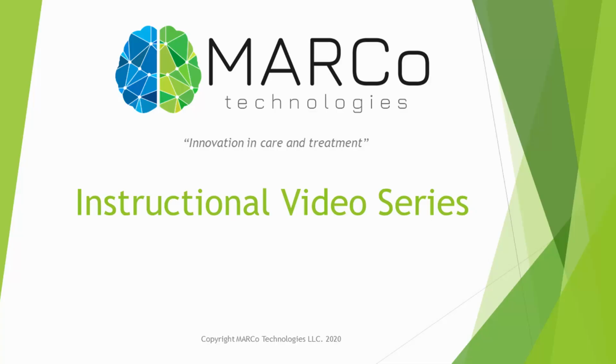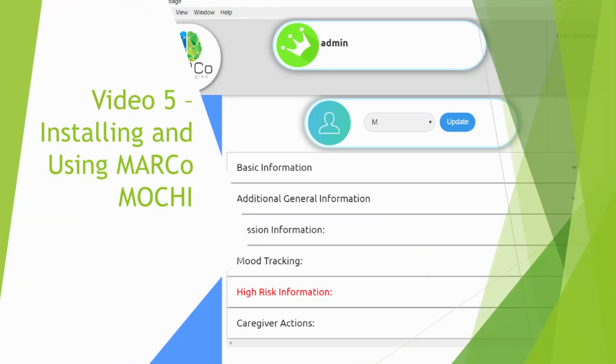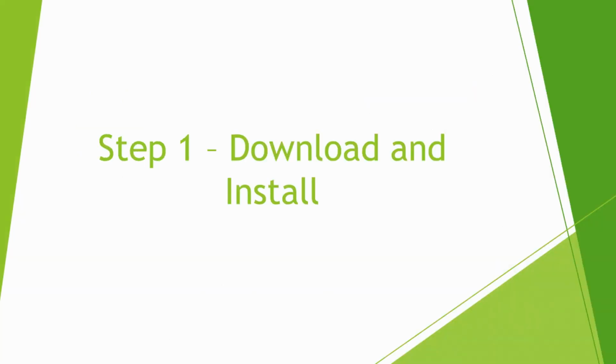In this video, we will cover how to download and use MARCo's Main Oversight of Companion History and Information, MOCHI, the caregiver software that allows for data review and control of each MARCo. Step 1. Download and install.